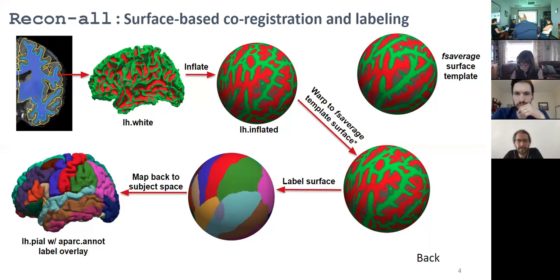So when we did this, that was a longitudinal study, so it's a lot of brains. When these things are labeled, they're pretty good, but they're not perfect. This one looks really good because I believe it was manually corrected.